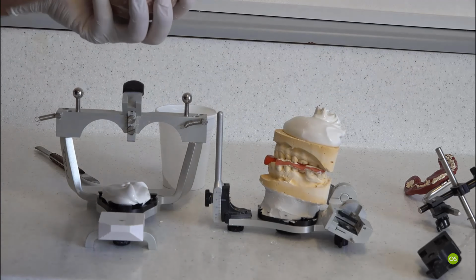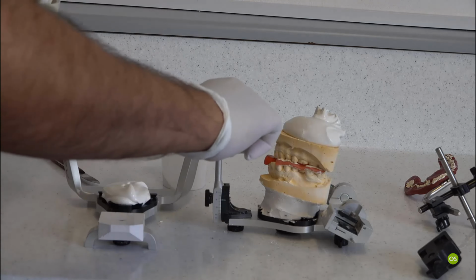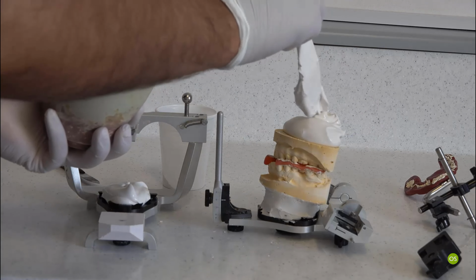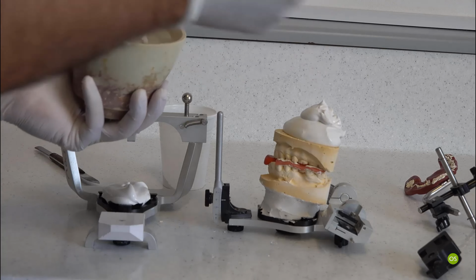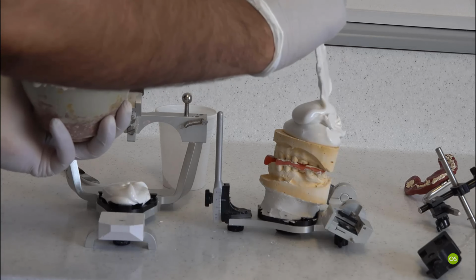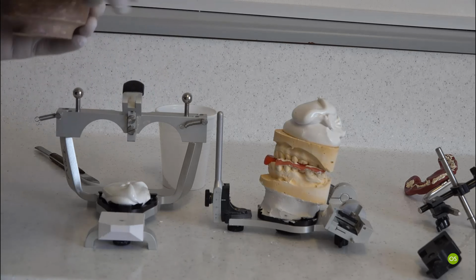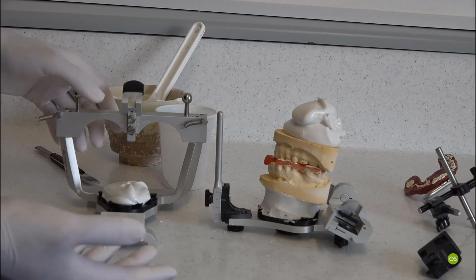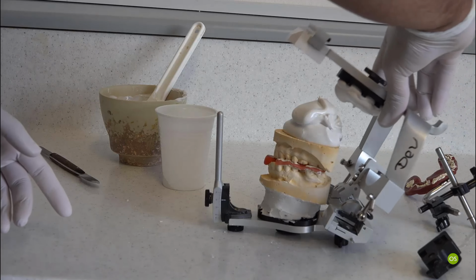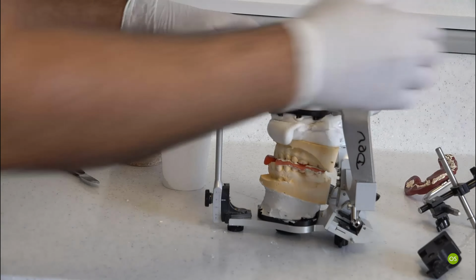The other way you can check whether you have built enough or not is when you are looking at this level here. Okay, so you will know that you got enough if you go slightly higher than that. If you don't have enough, you can do this in 2 stages, so don't worry if you try and put the model in and then it's not really enough. But in our case, we have enough there, more than enough.